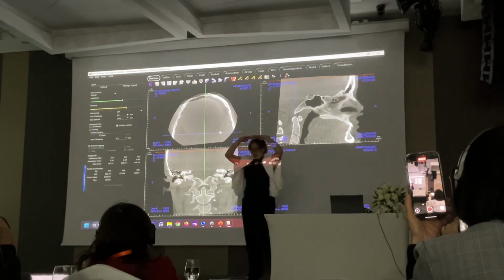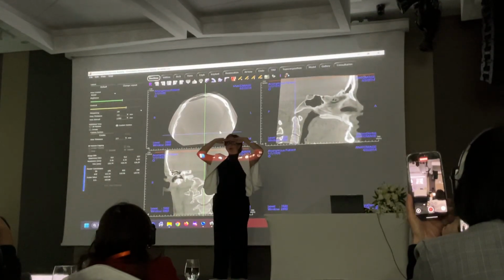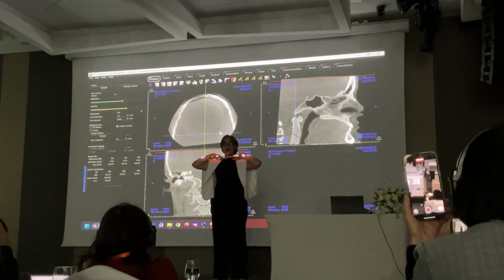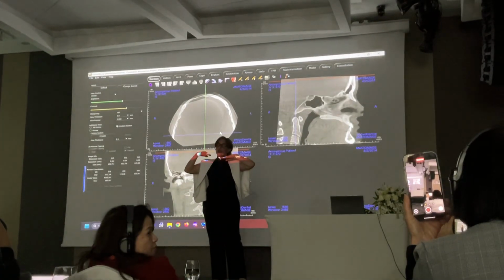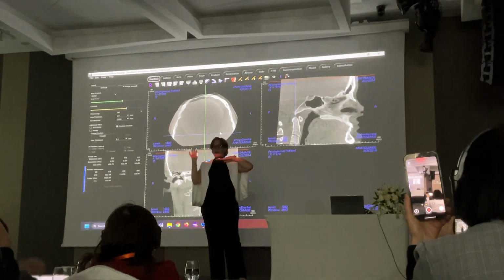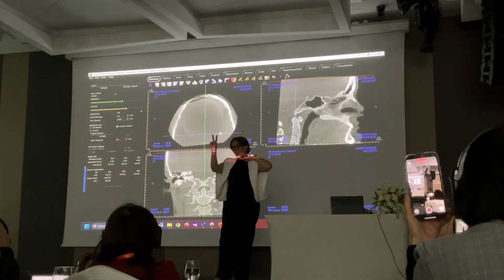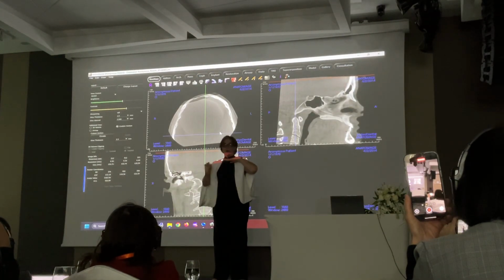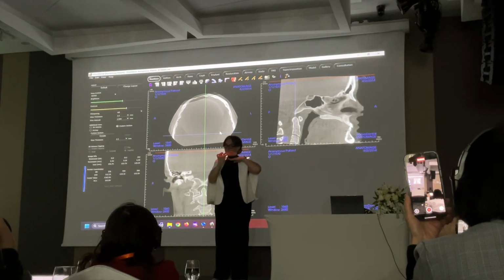So basically what you're doing is going from the top of the scan through each of these anatomical structures, one by one, all these black areas, all the way down to the bottom of the scan. And when you're done with the black areas, you're going to climb up the bones of the cervical spine. Remember that bone is made out of two components: the dense cortical outline that should be continuous and uniform, and the cancellous bone, the bone marrow spaces that need to be uniform, so no low density or high density in between.